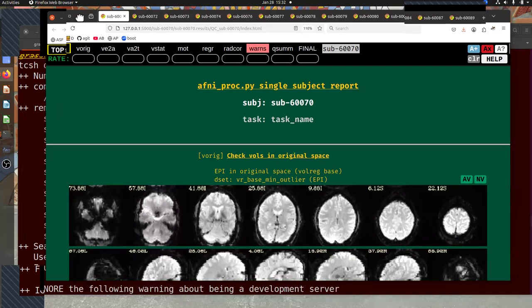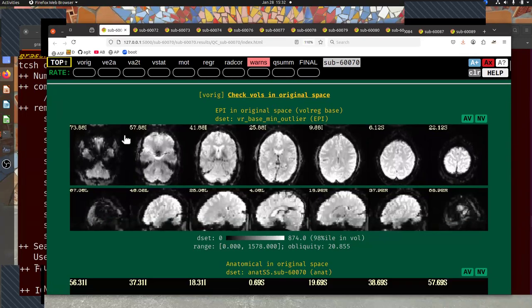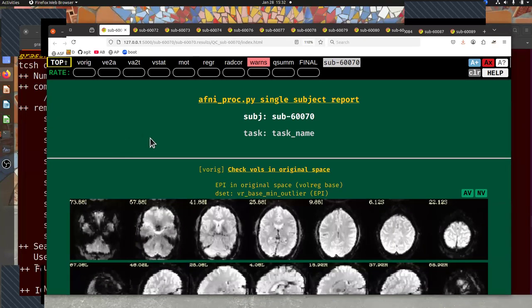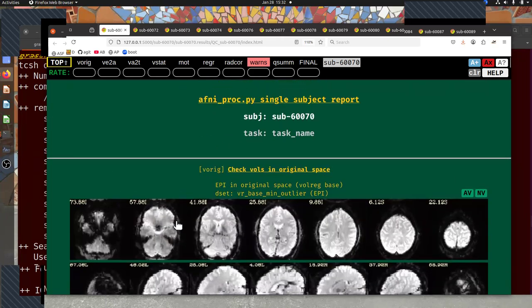If that makes any sense as I've described it, I hope. But otherwise, what we're going to do now is see some of the features of looking at multiple HTMLs and opening them all up together. I believe this is a slightly older set of HTMLs, and so a couple features aren't here, and a couple of the items, like the variance map, are not here. We just have to update it, but this will show the main point of what I want to show.